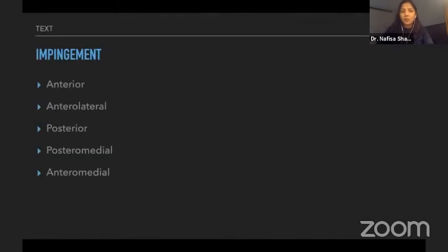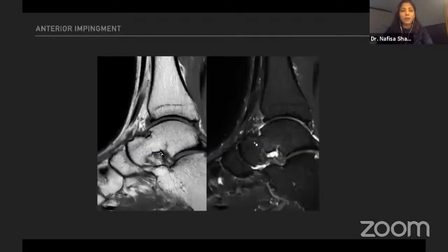So of course, impingements can be looked at on MR as well. And you also want to plan a CT if you're going in for a surgical approach. But for most cases, MR will pick up impingement. And in such a case, this is a patient who had these small spurs, early signs of impingement. The patient had pain in this region. At the time of acute pain, you'll be able to pick up capsular edema, marrow edema, whereas when patients are pain-free, these signs would not be seen. You could even pick up capsular thickening and scarring as well.